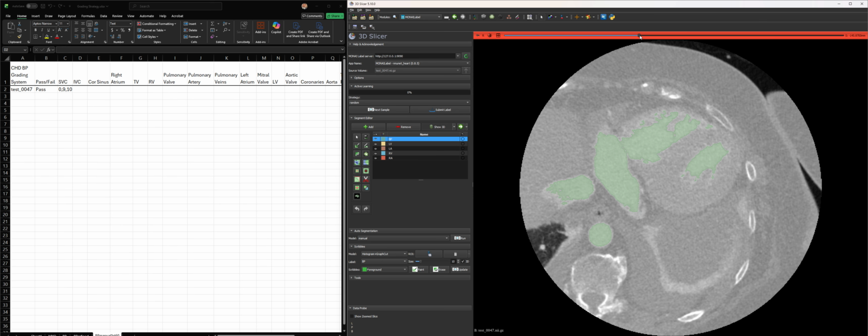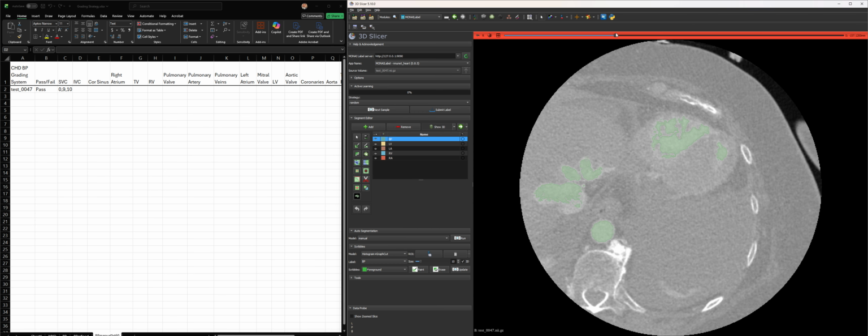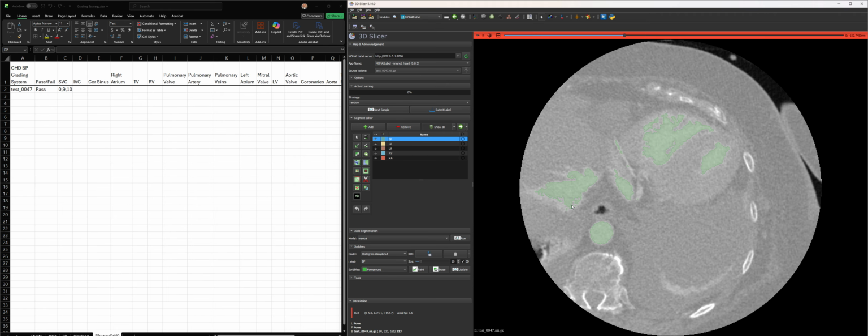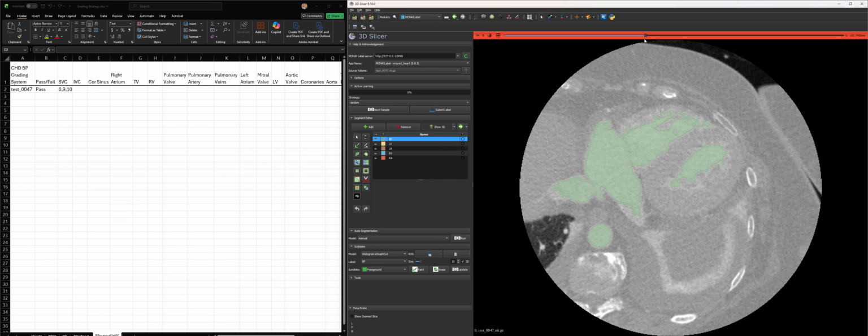And so if I get up to the point here, IVC is here. If I trace that up, it's got this stuff at the bottom. Overall, this is an excellent IVC. I'd say it also should have been a 10, 0, but it was probably an 8, which is really excellent for that. So coronary sinus always comes in the bottom of the right atrium and wraps around.